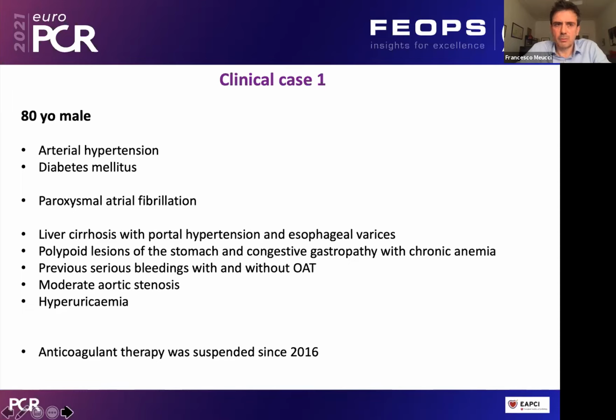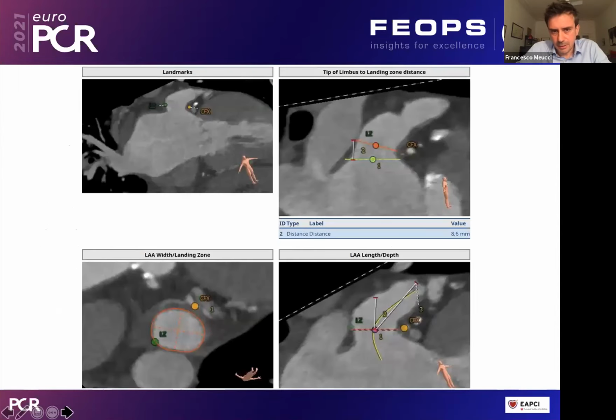We are not a center doing many ICE-guided procedures. We mainly use transesophageal guiding. And in this case, we did a CT scan, and these are the common reconstructions we do from the CT scan, with the measures of the landing zone and of the depth of the appendage.